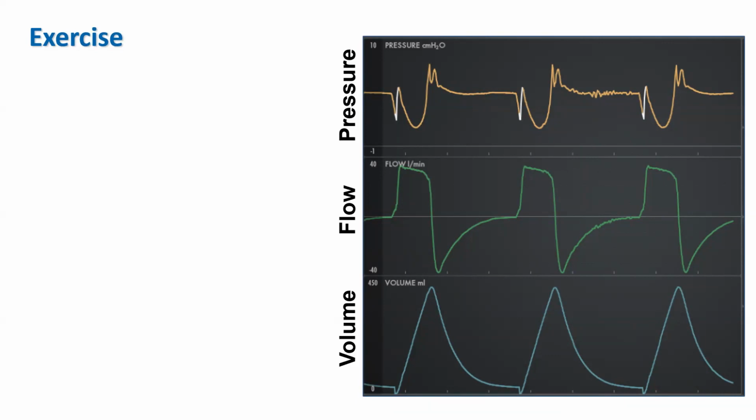In other words, what is the mode of ventilation for this patient? We're going to call it volume control, CMVS. How do we know that? Well, because we have a constant inspiratory flow.